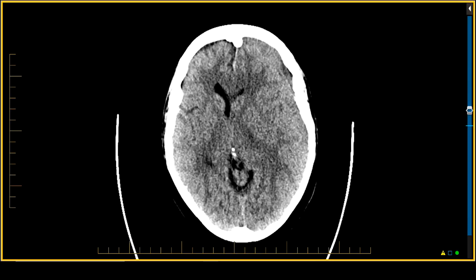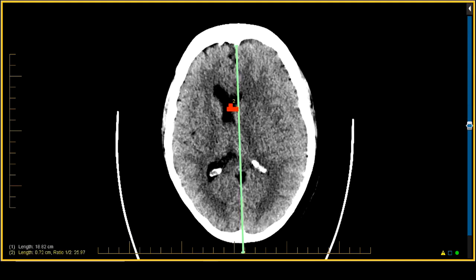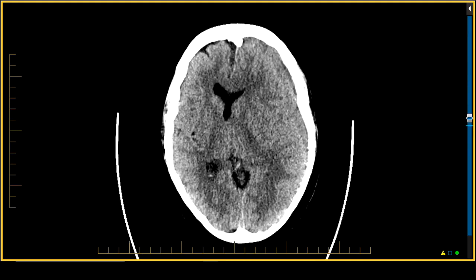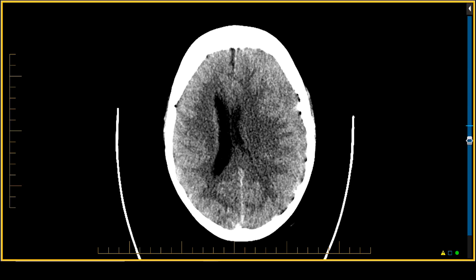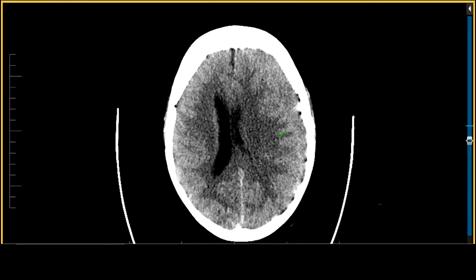Well, hopefully you would have identified that the juxtacortical white matter, which is going far out to the periphery on the right side and in the occipital region on the left side, does not extend to the periphery as far on the left side. Let me use my magic pen. What I'm talking about is this amount of white matter inward displacement compared to the white matter on the right side is one of the markers for an isodense subdural.